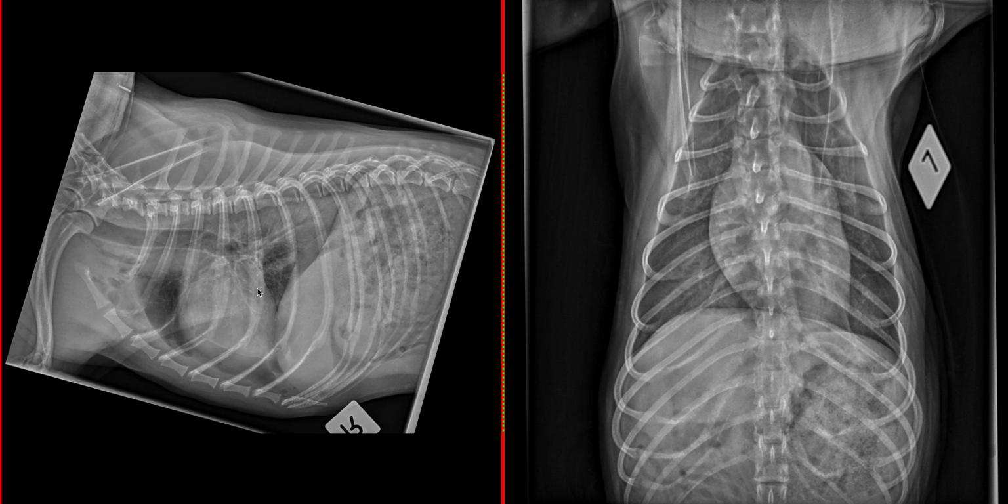Other things to investigate are rib fractures. None are identified here, but based on the curvature or shape of the ribs, typically the point of tension is at the arc. For this reason, rib fractures are often most commonly observed on the ventrodorsal view. Both pneumothorax and the pulmonary contusions that we've described can manifest as increased respiratory effort. If rib fractures were present, the associated pain could also contribute to an irregular respiratory pattern.